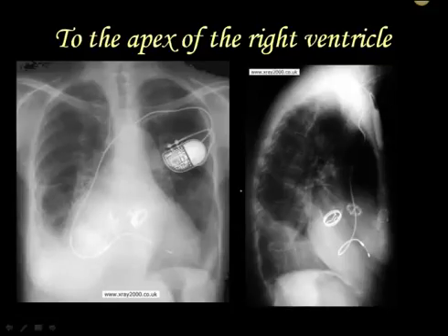Alright, so we've kind of talked about this. Incidentally, because I got into an interesting discussion with Delta about this, notice that we cannot see the right, well, we maybe can see a little bit of the right border of the heart, but we cannot see the diaphragm at all. That's because there's fluid up in here and everything. If you come over here to this one, we can see a diaphragm. The diaphragm that we are seeing is the same one that you're seeing over here. So what you are seeing is the left diaphragm. We don't see the right diaphragm here at all, any more than we see it on the PA. And the reason for that is the fluid is obscuring the border. This is back to the silhouette effect.